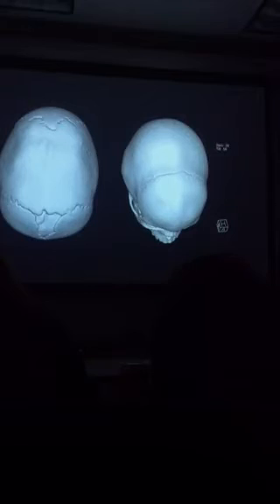So here's premature closure of the sagittal suture. You don't even see it at all. And this is a baby. This is the fontanelle, the soft spot. Does the brain still function properly in that? Oh yeah, yeah, yeah.